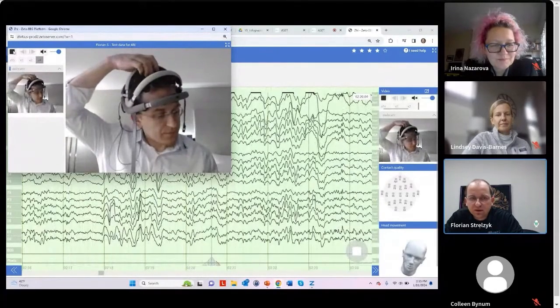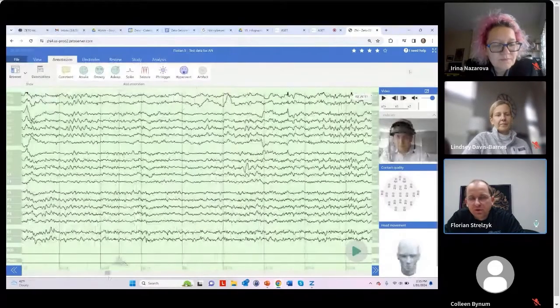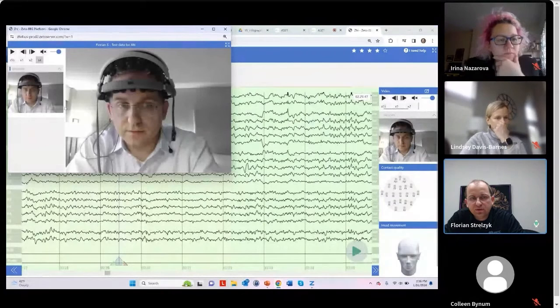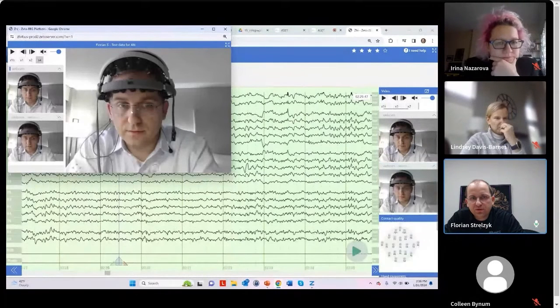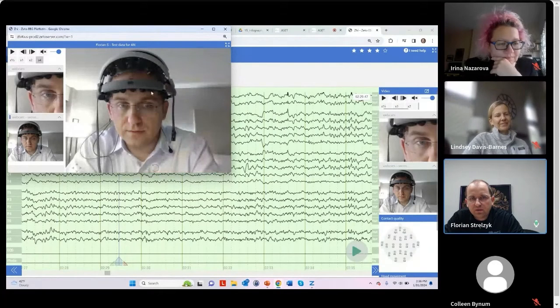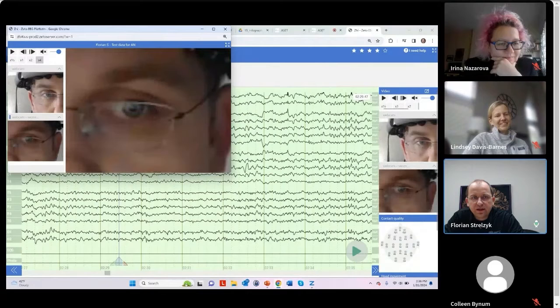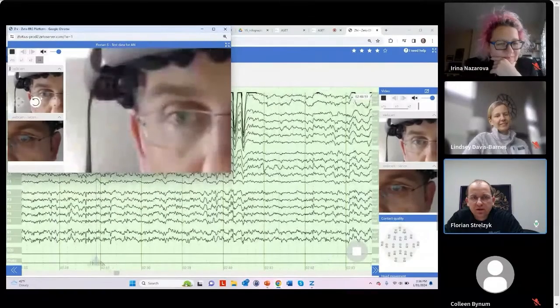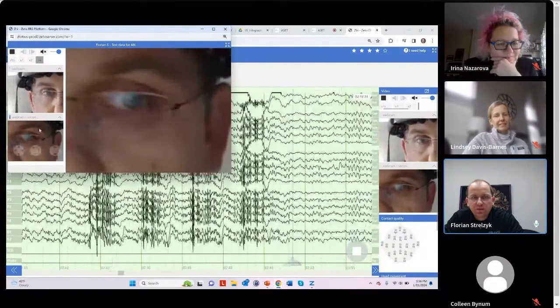So let's look into what I can do now. On the video side, I can create a secondary view. So that's just a copy of the first view. And I can do funny things like put one view on one eye, the other view on the other eye. And now as I'm reviewing, I can see each eye as a close-up, or I can just swap back and forth.